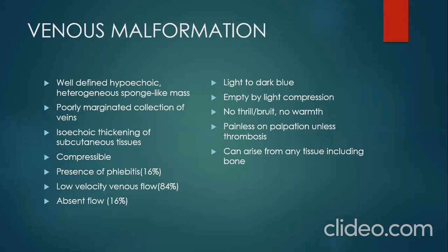All right, so venous malformation. Clinically, the area of this venous malformation is light to dark blue, and it empties with light compression. When you compress, the veins are empty. There is no thrill or bruit in this lesion, and they are not painful for the patient unless there's a thrombus. And this can arise from any tissue, including the bone itself.